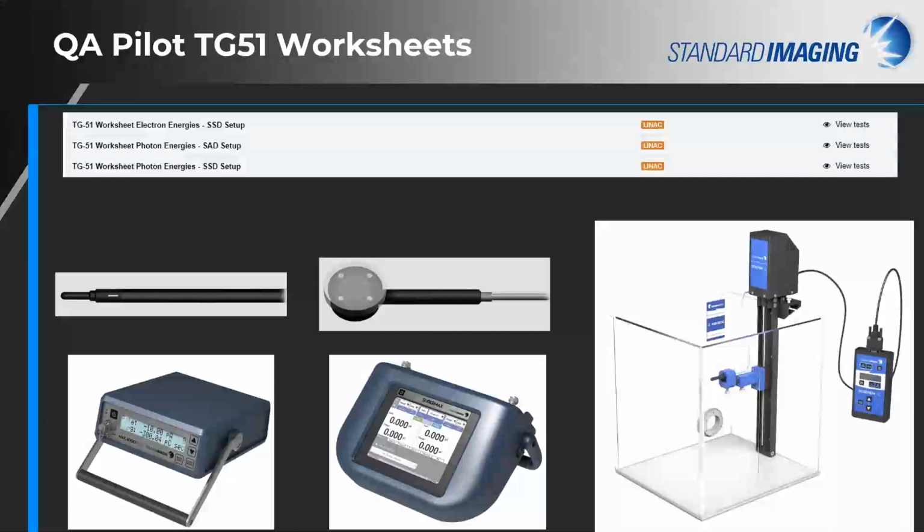Another of the presets that we have isn't just a template, but what we call the TG51 worksheets. These are designed to simplify your workflow with multiple energies supported per worksheet. Equipment used for TG51 is easily managed within the QA Pilot device management section for things like ion chambers and electrometers, which can also then be assigned to specific QA schedules. Device calibration information, including the calibration reports, is stored.